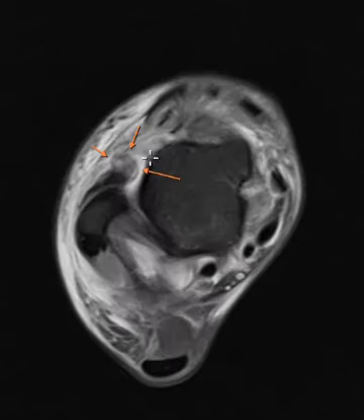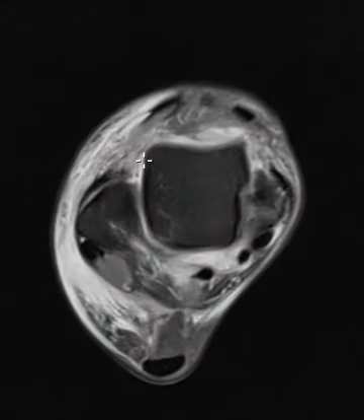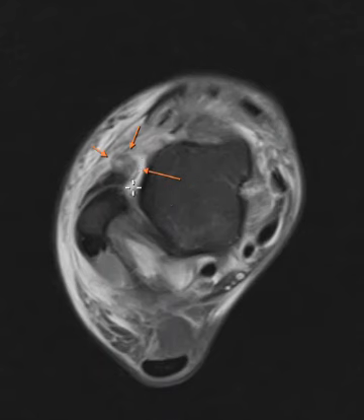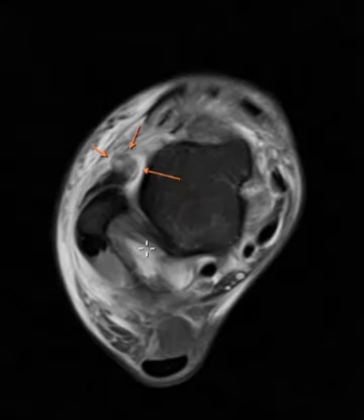And it should come right across here, from here to here, or right where it's square, starting about there. You'll see it come obliquely. But instead we see this balled up anterior talofibular ligament. There's fluid undermining it here, and there's lots of edema around the lateral side. So here's a really basic, easy example of an anterior talofibular ligament rupture.